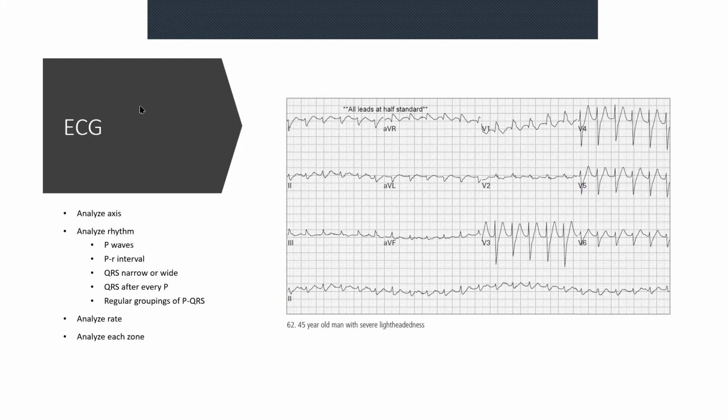Pointing the wrong way. All right, so we have another ECG one today, and not a very difficult one, but just one that we should have a look at. It's something that you may see from time to time in your practice, so it's something that you need to know about. So this is the ECG.